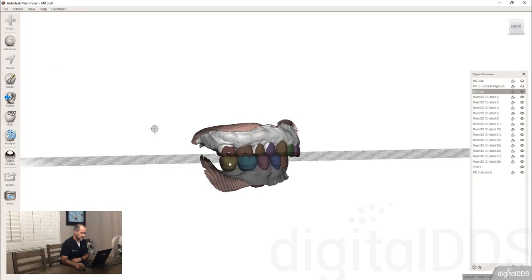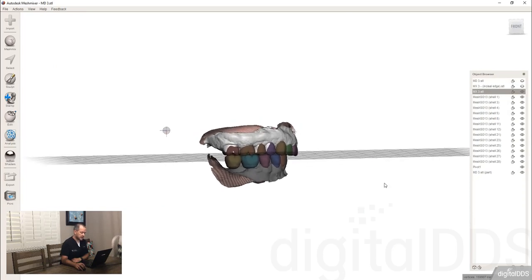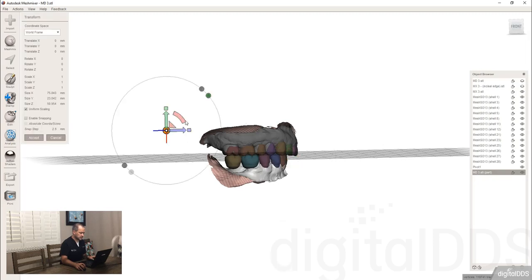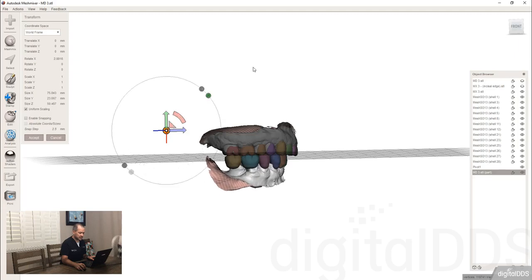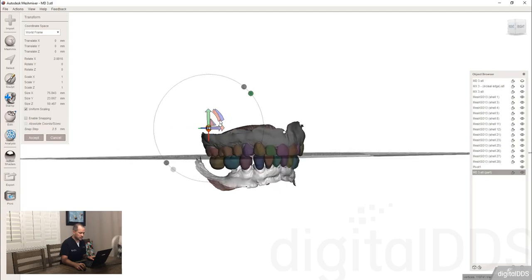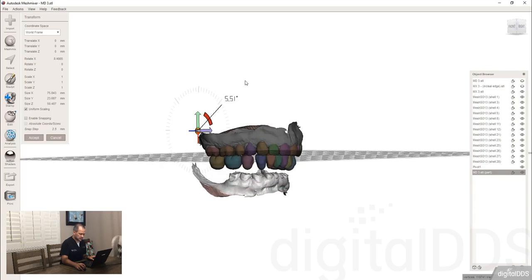Now that being said, technically, because I already did all that, if I went back and wanted to use the same exact rotation point, I can. So you don't really even have to keep the articulator in there if you don't need it visually, but it's up to you. Right now technically my model's changing, but the articulator is not.